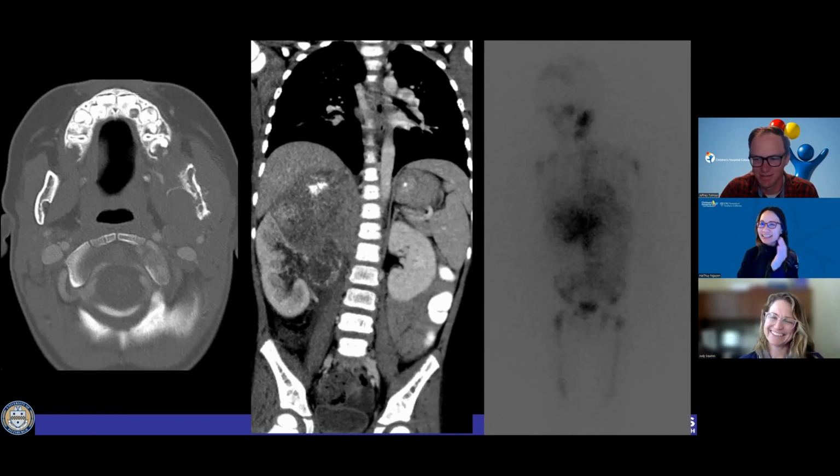And then I think at that point you would just direct them to the other workup, and maybe an abdominal radiograph to see if you can see the calcifications. Whatever is minimally invasive to start, if you're not that confident that there's metastatic disease.